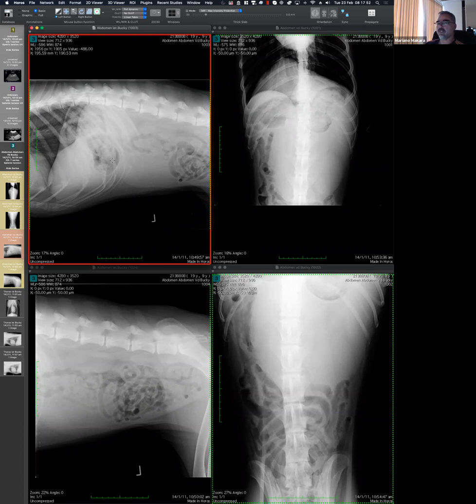So this is a very good telltale. If you consider that option, probably you should say, well, I can't completely rule it out, but it's unlikely because the stomach sits in the normal place. Makes sense? So again, we are using something easy to identify, our knowledge about the anatomy and how things displace depending on where the mass is coming from. So your consideration about the spleen is a very good one.